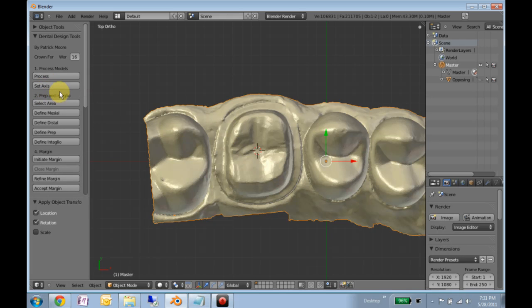Luckily you can't forget it because it's transparent and that's kind of weird, so that should remind you to set axis. The next thing we want to do is segment this mesh into some smaller pieces for two reasons. One, we can use those pieces to again facilitate automatically orienting our restoration, and two, by clipping out just the data we need, we improve the performance and things speed up. What we'll do is make sure that this is still selected. Again, now it's highlighted in orange.